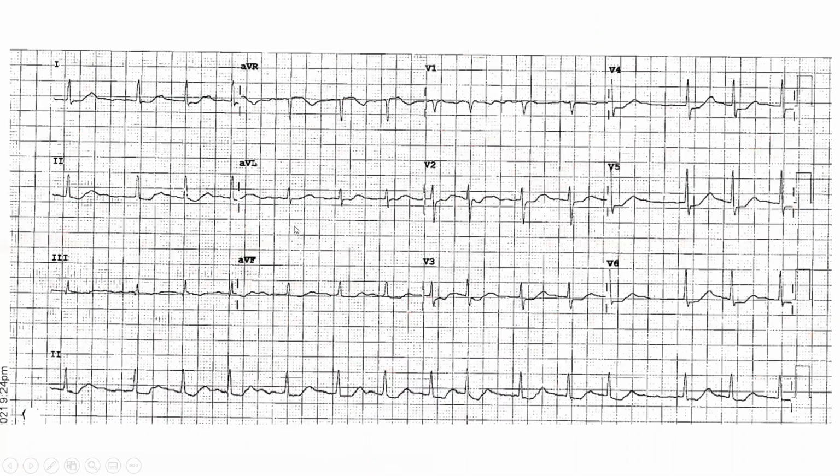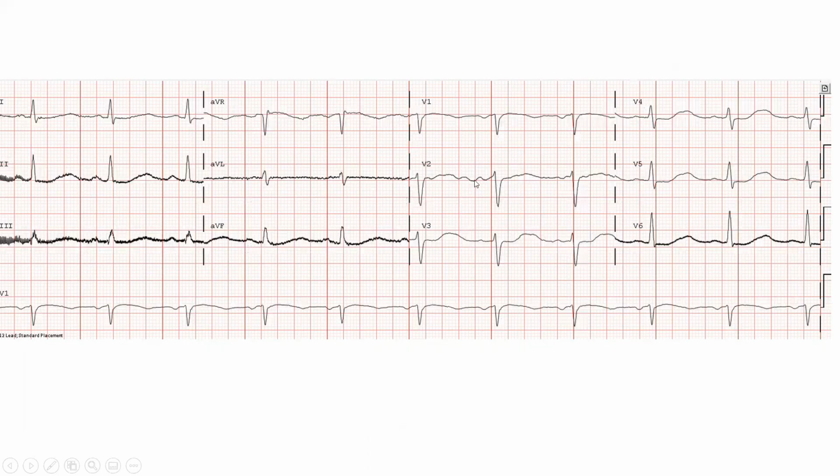This weekend, I was called by another institution for transfer for STEMI or acute MI based on that EKG. Well, again, this is a patient with AFib. He has diffuse ST depression with ST elevation in AVR and V1, suggestive of diffuse ischemia. But there is a catch. This patient is coming with nausea and fatigue and vomiting, no chest pain, and the potassium is 2.6. So this is another hypokalemia EKG. This one, the potassium was 2.6 as well.